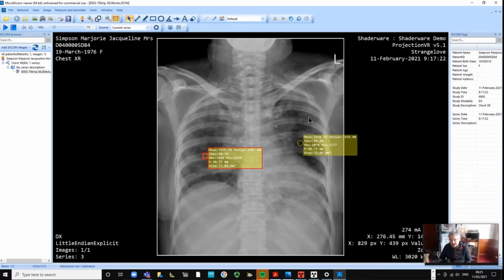And then we put the background region of interest in the 6th intercostal space in the mid-clavicular line on the left-hand side. To reproduce that, they could find the mid-clavicular line, count down to the 6th intercostal space between the two ribs, and draw a 75 millimeter square circle and reproduce that. Do you see what we're doing? Yeah, that makes sense. Fine.